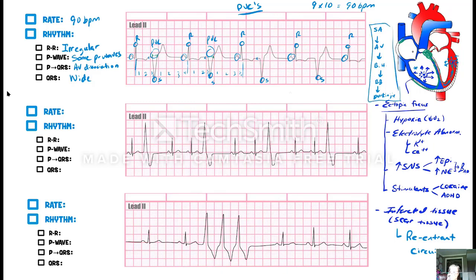All right, before I move on to this next EKG, remember I told you guys that this is weird, that these QRS waves are actually going to be negative in deflection? Go back to the basics. Remember, this is lead 2. Negative electrode here, positive electrode here, right? And then we create this axis of this lead. Remember, the QRS vector, the mean, you want it to point towards the positive electrode.